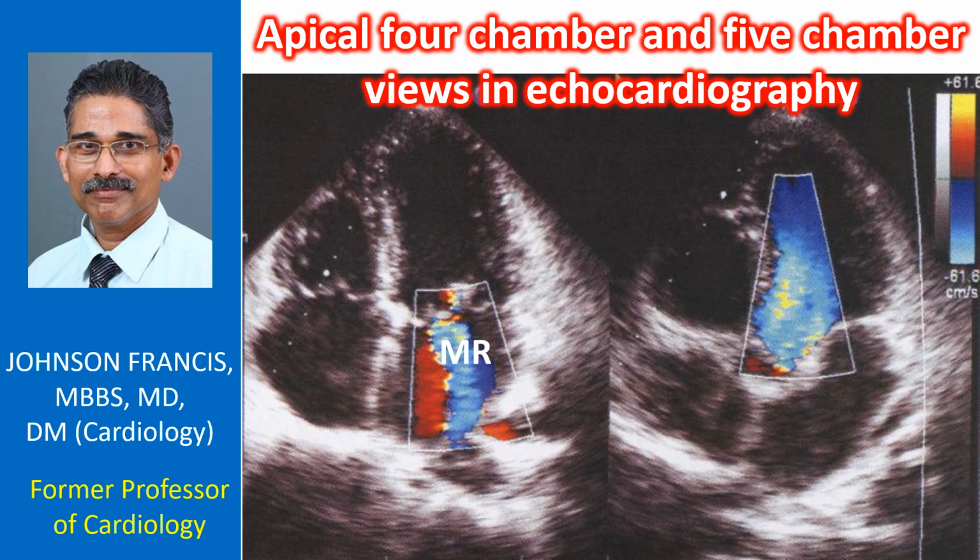The difference in the levels of attachment of mitral and tricuspid valves can be appreciated in this view. The tricuspid valve is placed slightly distal to the mitral valve. The valve should be attached at the same level in the presence of inlet ventricular septal defect.